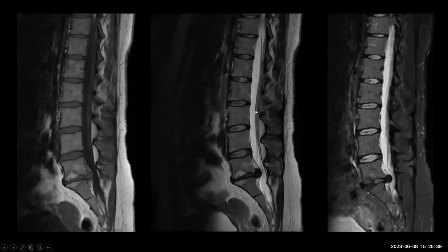Now going back, the term disc protrusion. At the level of L5-S1, you see that the disc height is reduced. The disc signal is reduced, because normally you have a bright signal. There is slight end plate irregularity, there are Modic changes. I'll discuss those in a while. And you can see that there is a disc extending backwards and uplifting the posterior longitudinal ligament.